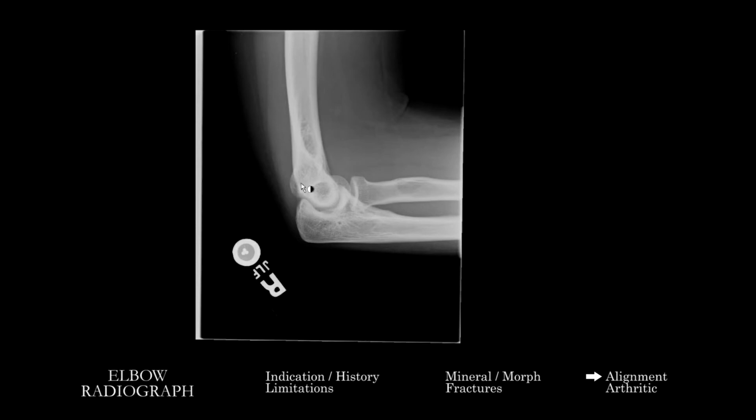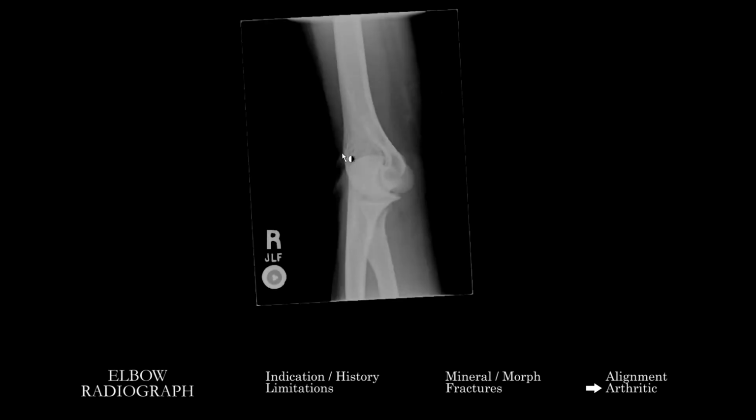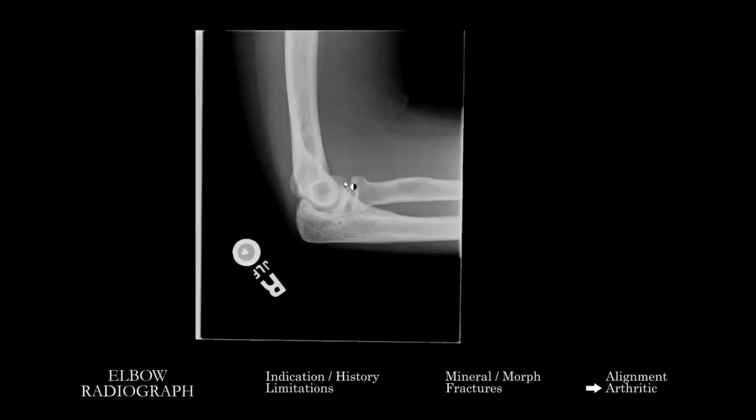All right. As an upper extremity, non-weight bearing joint, the degenerative changes are not going to be as common or as advanced here, but you do want to look for the common things for osteoarthritic changes: joint space narrowing, osteophytosis, cystic change, sclerosis around the joint space, things like this.